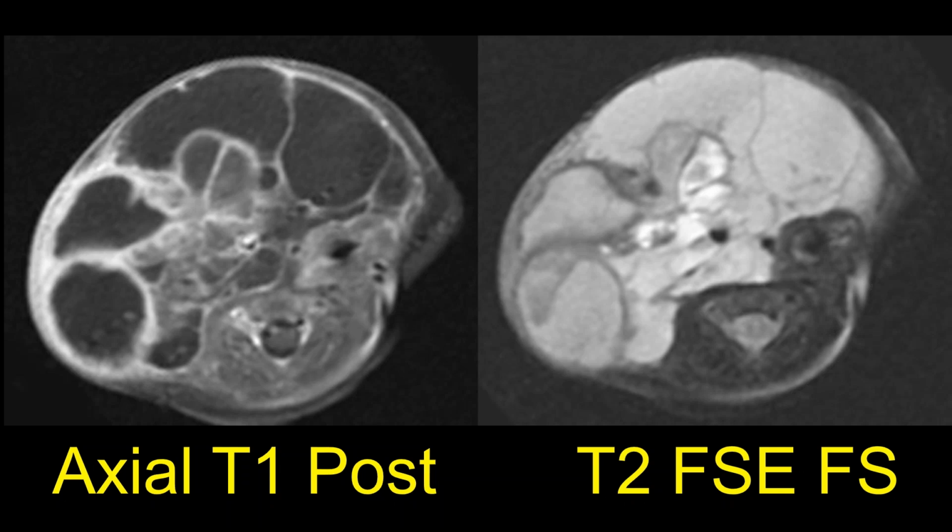And there are some congenital pathologies. This is a venous lymphatic malformation. Sometimes it's mostly venous elements. We sometimes talk about that as a hemangioma. And sometimes it's mostly lymphatic elements. We might call that a cystic hygroma.